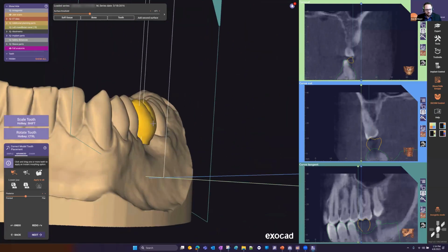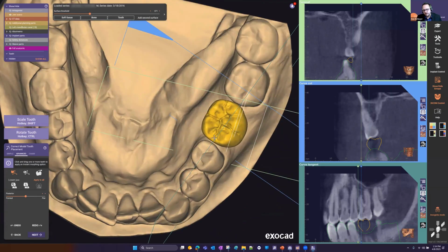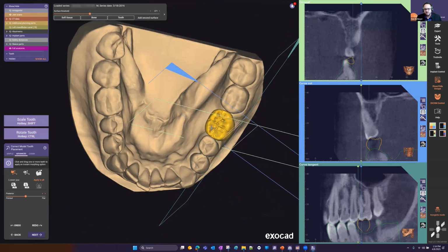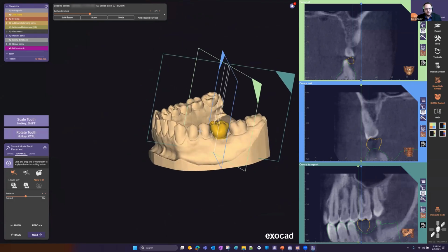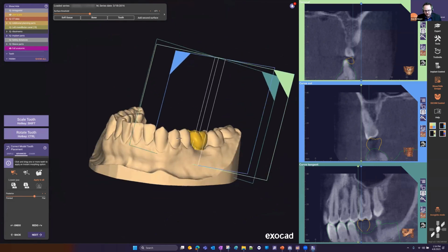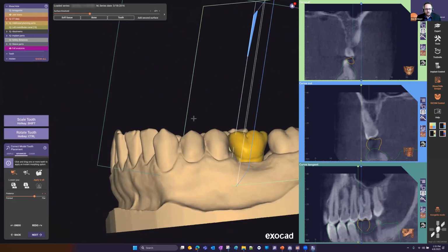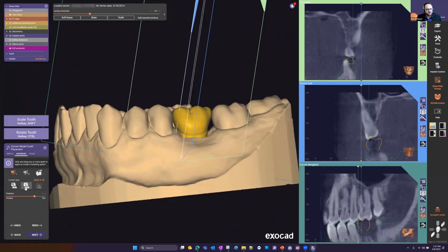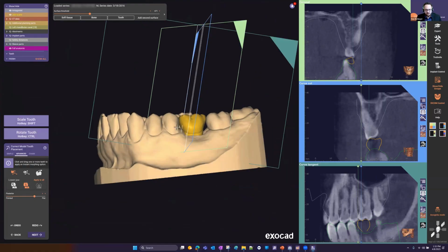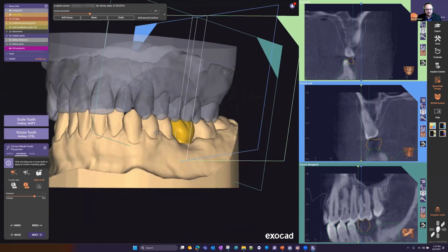And at this point, we don't necessarily have to have a perfect tooth. So you'll have plenty of opportunity if you're utilizing the immediate load workflow in DentalCAD to adjust your tooth shapes. You may want to use the pointed to flat slide bar to adjust the anatomy and shape of the cusp tips that are being placed. So from here, the next thing that I would utilize is our instant anatomic morphing. So what this will do is it's basically going to adapt your design to the opposing automatically. It's a big time saver there.